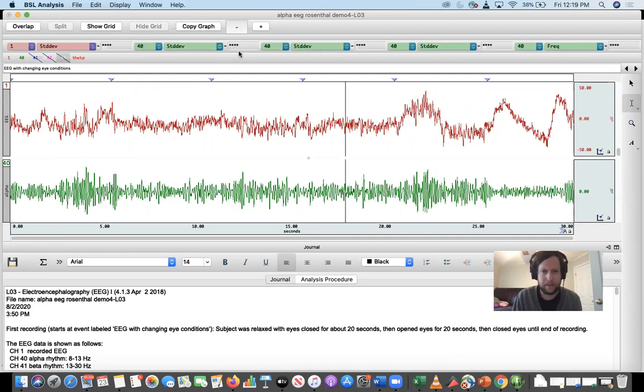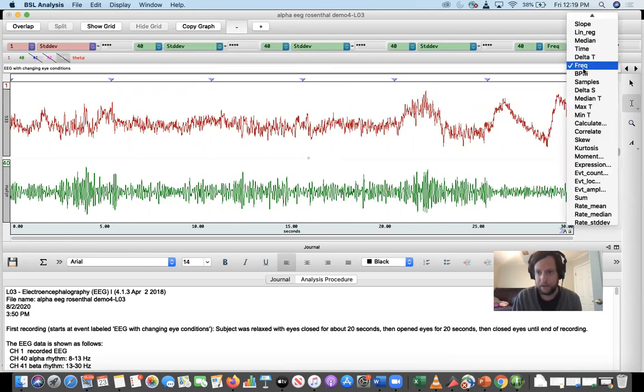Just to avoid confusion, because we don't really care about channels 41, 42, 43, I just changed all of these numbers to 40 and standard deviation, 40 and standard deviation, 40. Oh, that one says frequency. Where's standard deviation?